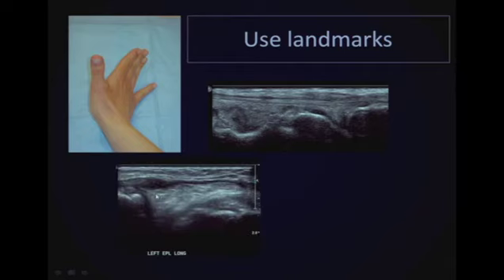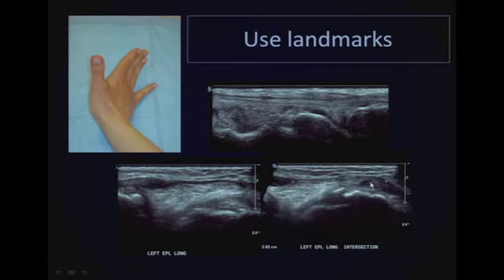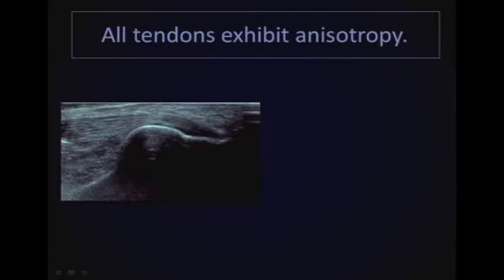And here's what she found in the abnormal side. She did not see the normal tendon structure extending across the image. There's an empty tendon sheath here. This is probably the free edge of the ruptured tendon, maybe here. You can see with a bigger field of view, you can see again the free edges of the ruptured tendon and the empty space where the tendon should belong. So this is a ruptured extensor pollicis longus tendon.